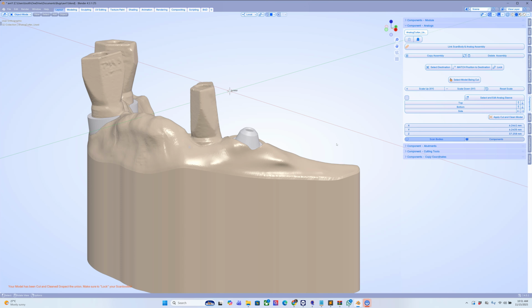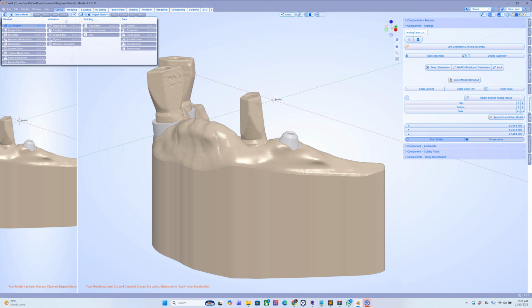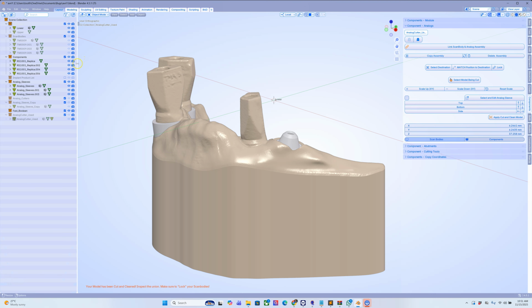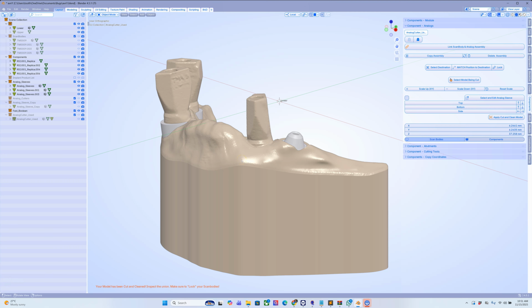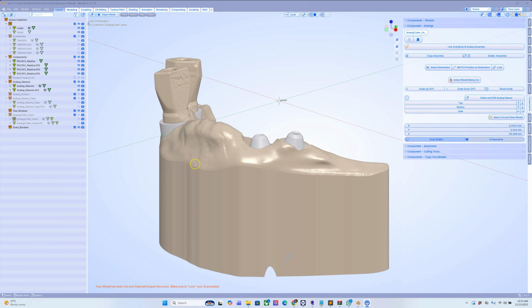Now in this Blender Update version we can see which boolean was used. Blender's got the exact and it's got the fast. The script will detect which one has been used. If the mesh geometry was good, it will use the fast boolean. If it's not, then it will use the other one, the exact boolean. So let's do the next one. This one took a while to process, and for good reason it used the exact boolean.